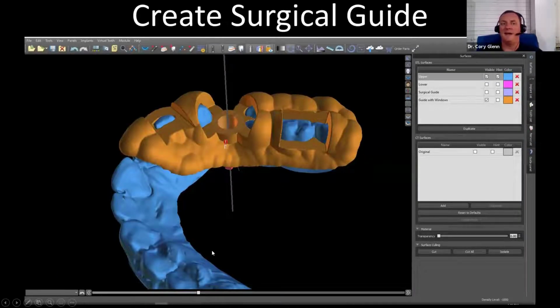And now we went back and exported that, and now we're creating the surgical guide. Now, the one tricky part to this is that I've got to ensure that the implant is in the exact same degree of rotation in the mouth that it was in the software. Because if you think about it, all your abutments, at least in Biomax, have a hex, so there's one of 6 ways that it can seat in there. If I'm 20 degrees of rotation off from one of those, well, everything's going to go on crooked. And so that's an important thing to translate here. During our guided surgery, we've got to get the timing of that implant exactly right.